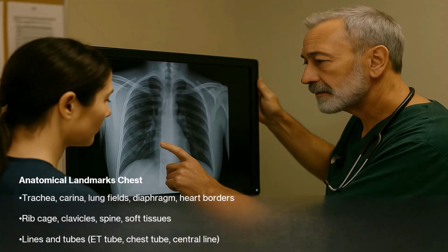Radiographers must understand the anatomical coverage required. We begin by recognizing anatomical landmarks such as the trachea, the carina, lung fields, diaphragm, and heart borders. We look at the rib cage, clavicle, spine, and soft tissues, and then we look for the lines and tubes.